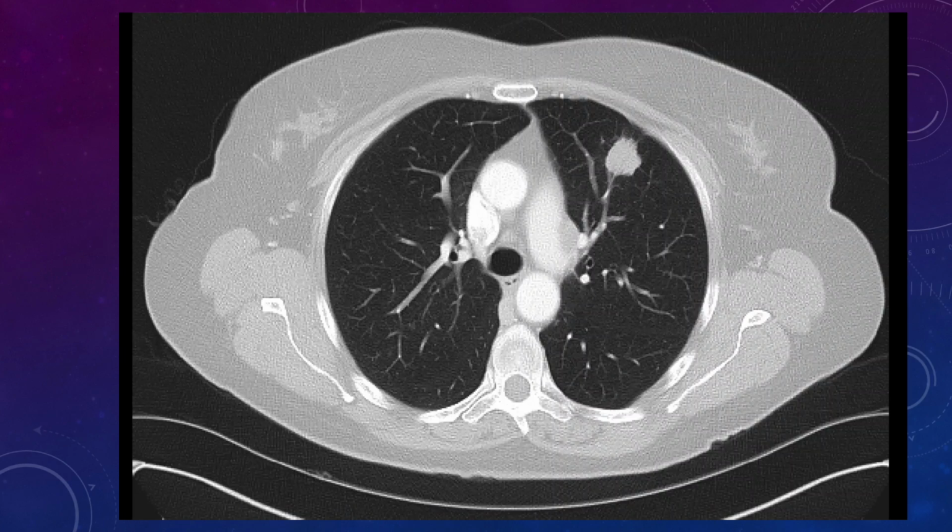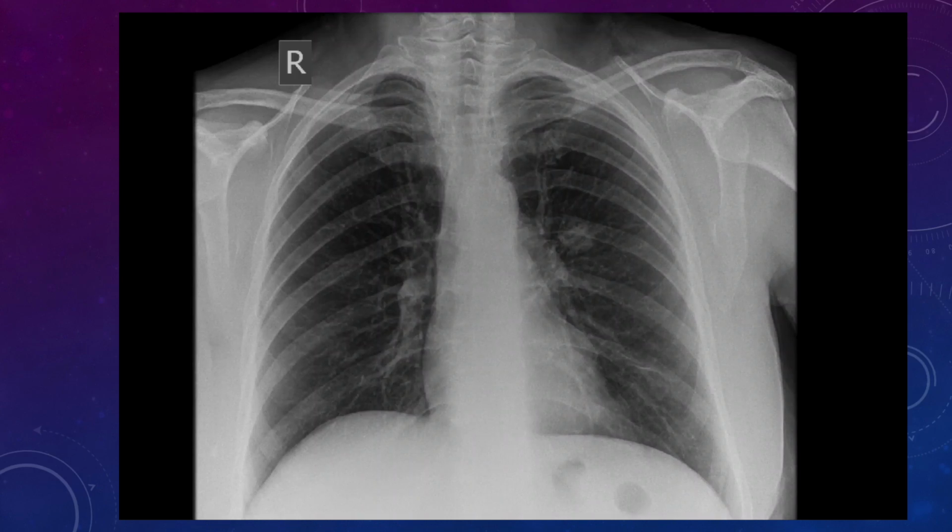And there's your lesion on CT. Comes very easy. Taking it back though, easy to miss. Just on the periphery of that AP T-spine image. If the radiographer had coned it any tighter, then we wouldn't have appreciated it. That could have gone undetected. So, yep, good spot, Craig, yep. Okay.